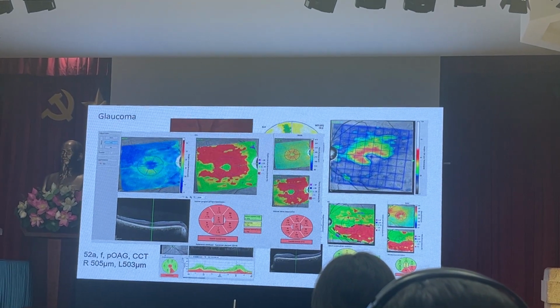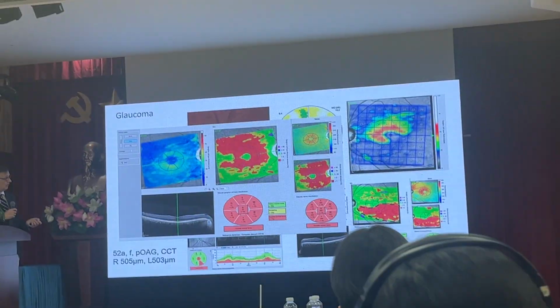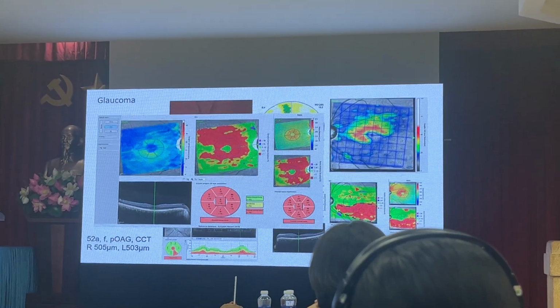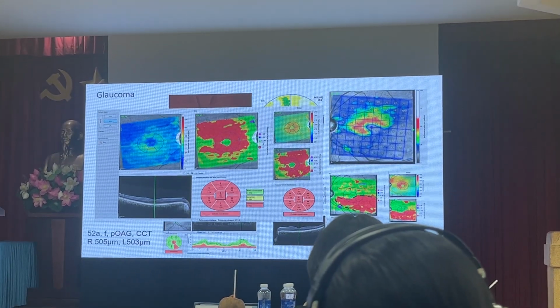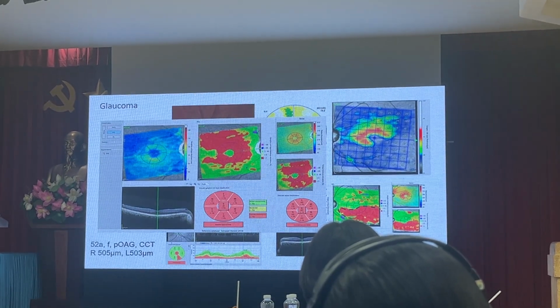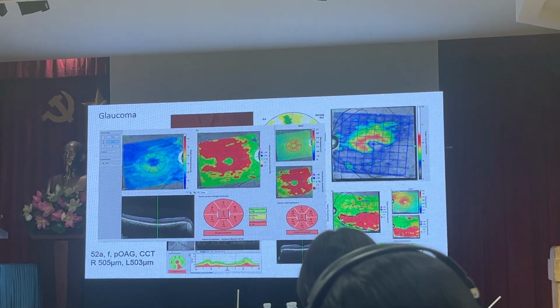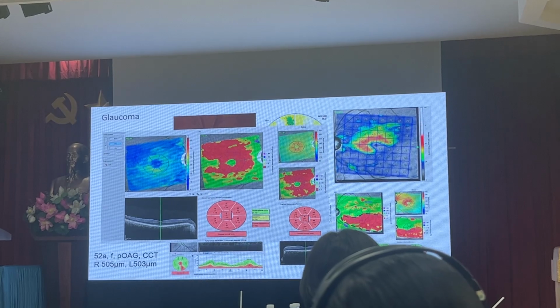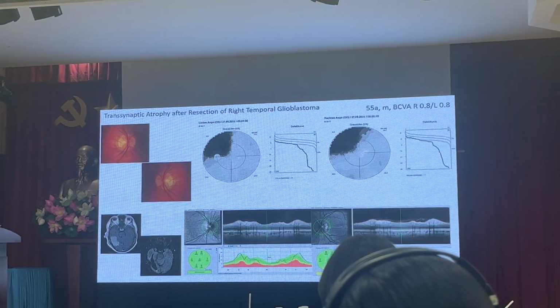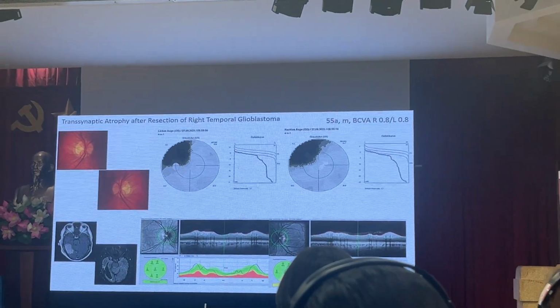And if you look at very progressed glaucomas, you will realize that we also get a circle-like loss of ganglion cells, but these ganglion cells are not only confined to the center, as in the red circle sign, but it also affects the more peripheral macula, where we find the M cells, typical or rather often found in glaucoma, M cell loss. So let's look into some neurological diseases.